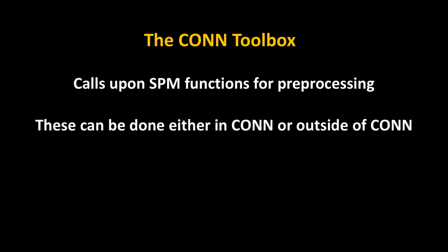Now, as was mentioned before, what if you have everything already processed outside of the CONN toolbox? You've already done all your pre-processing outside of it. That's totally fine because CONN will give you an option to simply import that. But if you want, you can do it either way.